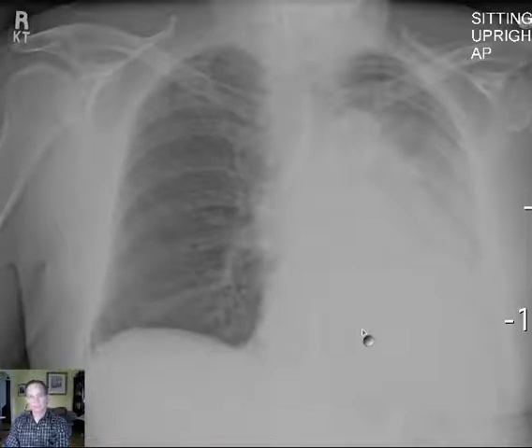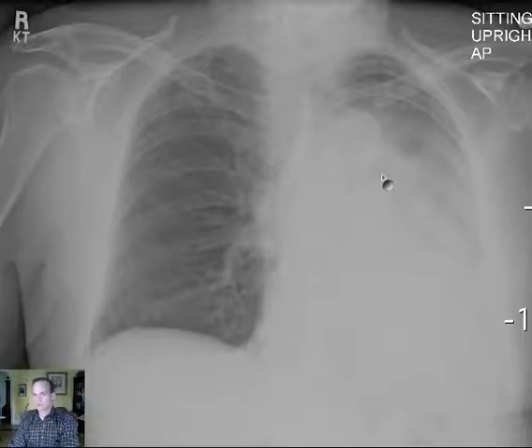Well, we mentioned one possibility, pneumonia with mucus plug causing volume loss. Maybe just a mucus plug causing volume loss or some other inhaled foreign body. Could it be cancer? Of course, this is one thing you almost always want to ask in the case of a chest radiograph that's abnormal, particularly when there's volume loss, because very often tumors, especially primary tumors, occlude the bronchi, one or more bronchi. So a good study for that, CT. Let's see what a CT shows us.